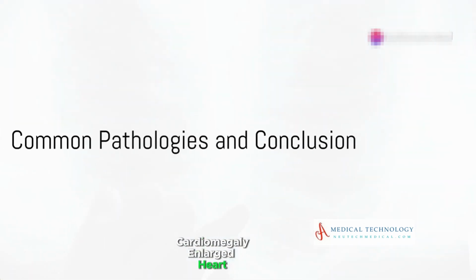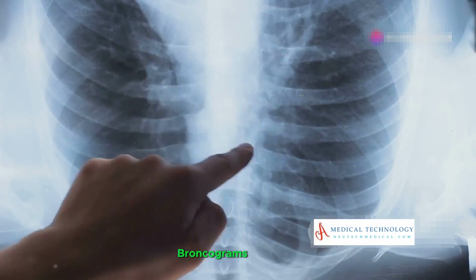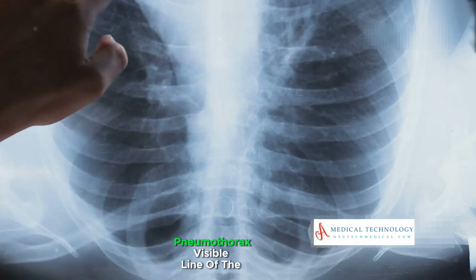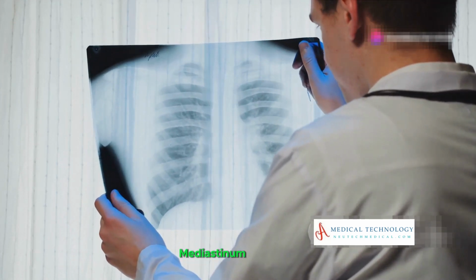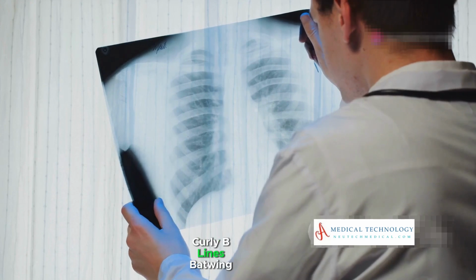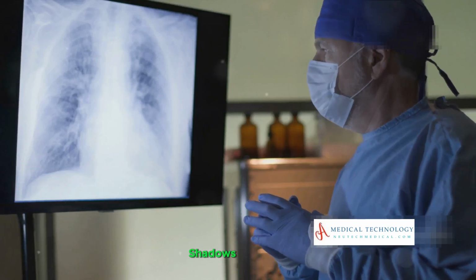Cardiomegaly: enlarged heart silhouette. Pneumonia: consolidation, typically with air bronchograms. Pleural effusion: fluid levels in the pleural space, seen as meniscus sign. Pneumothorax: visible line of the collapsed lung with no lung markings beyond it. Aortic dissection: widened mediastinum, abnormal aortic contour. Pulmonary edema: Kerley B lines, bat wing appearance, pleural effusions. Rib fractures: breaks or discontinuities in the rib shadows.